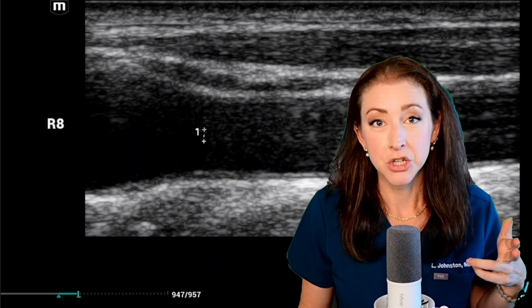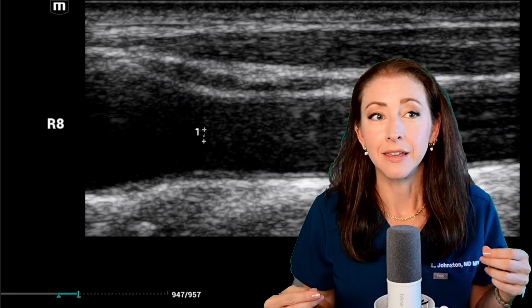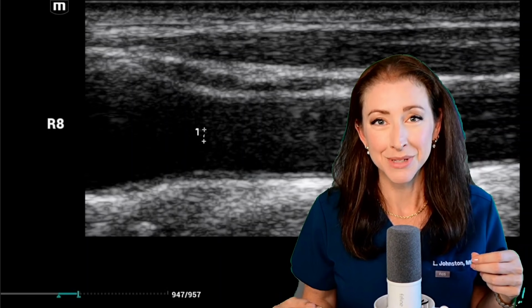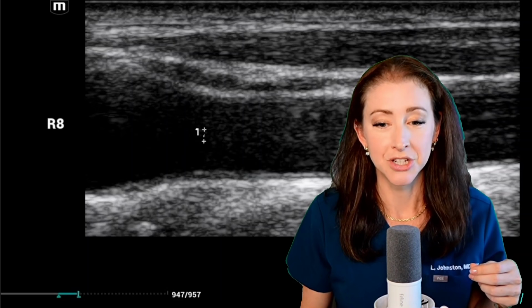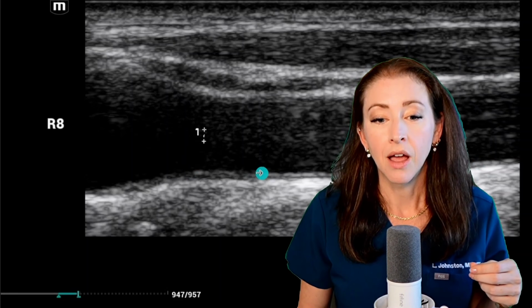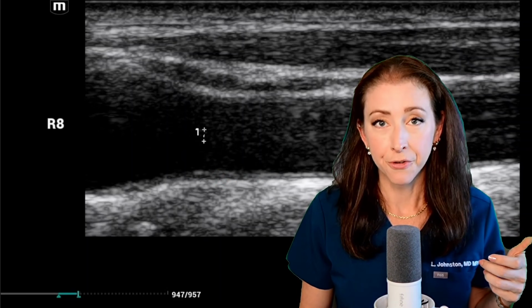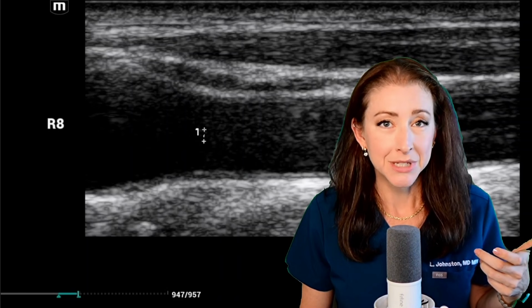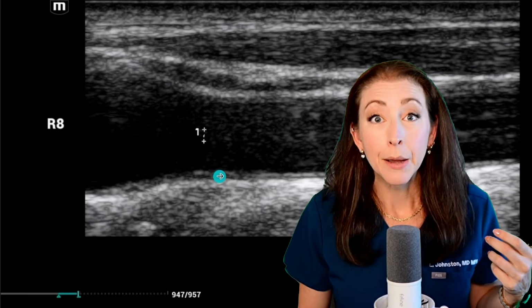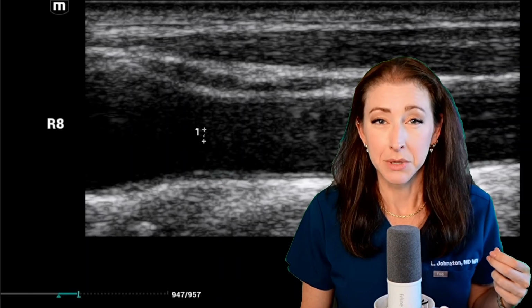The right-sided images will then get averaged with the same pictures on the left, which I will show you. That is how we generate the IMT number that comes out in the report. So when we go over that, you'll remember having looked at all these images to see where this comes from. Now, when I go through pictures with clients right after their scans, I tell people, I can't tell you whether your IMT is going to be abnormal for your age or not, because we are measuring this down to hundredths of a millimeter.